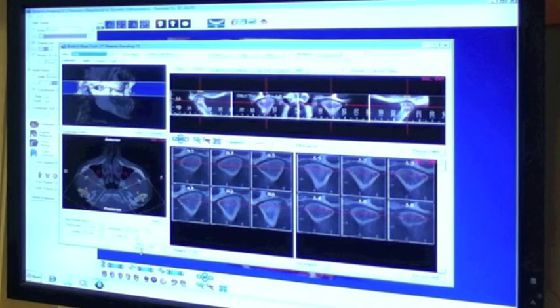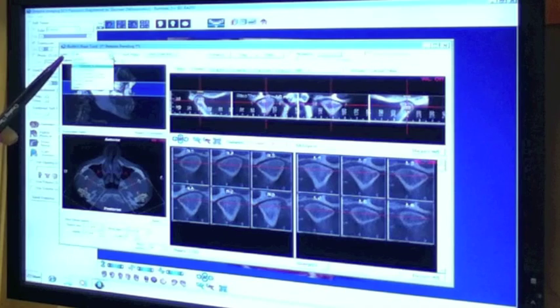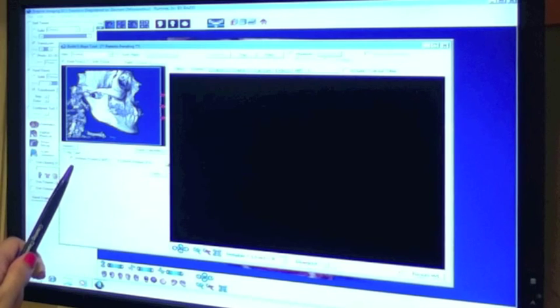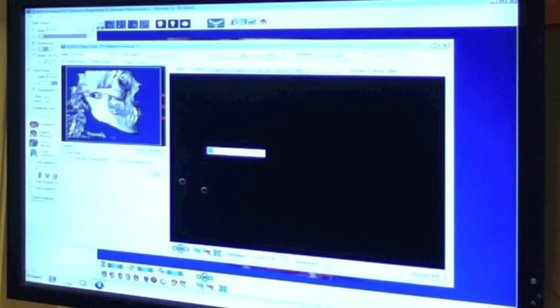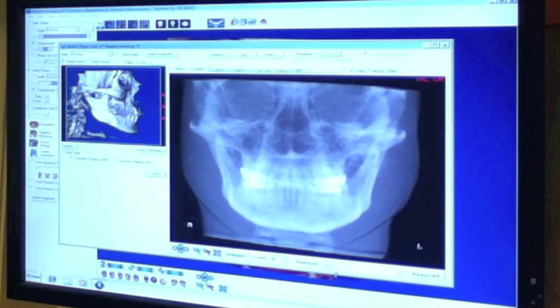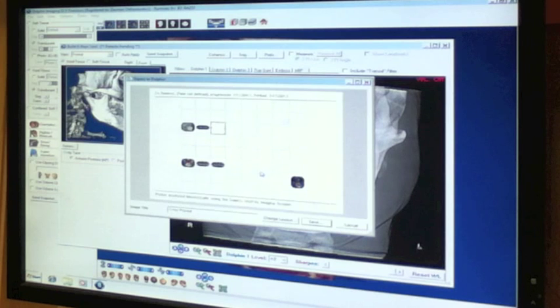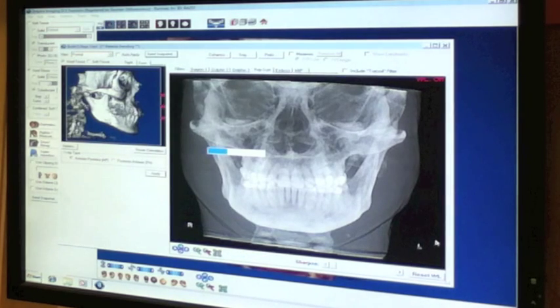Once you've finished your TMJ x-rays, you'll go to view again, and the final view will be the frontal view. You'll want to make sure it's set to the anterior posterior, and you'll click apply. And then again with all the other x-rays, sharpen and change the level to the doctor's preference. And then you want to send snapshot and save to your Dolphin layout. And this x-ray will go to the correct spot, the 3rd row down, the 3rd box over, labeled x-ray frontal, and save that.